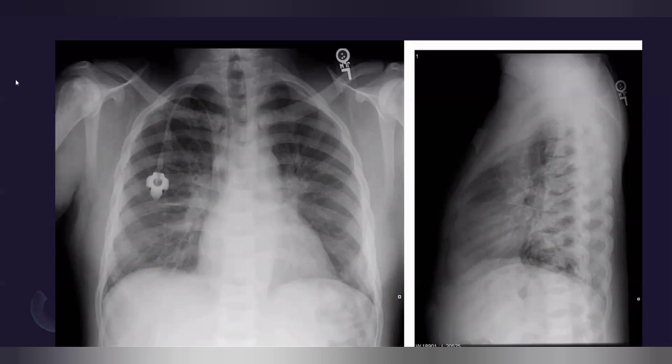So bone density appears normal. All the joint spaces are preserved. There is a slight sclerosis and increased density in the bilateral humeral heads, likely due to avascular necrosis. Cardiac size is mildly enlarged, and the visualized vertebral bodies are slightly depressed centrally. So it might be a case of sickle cell disease with bilateral humeral avascular necrosis.